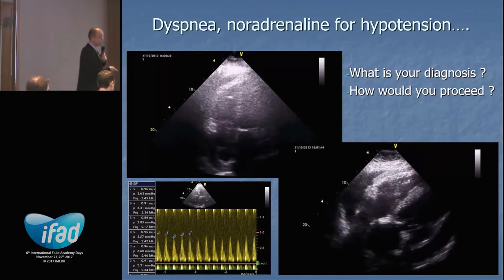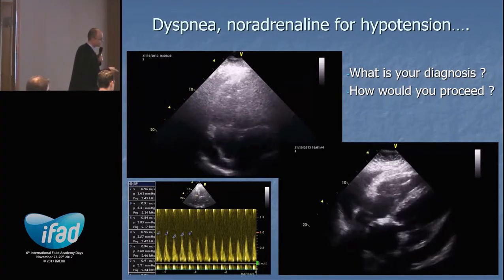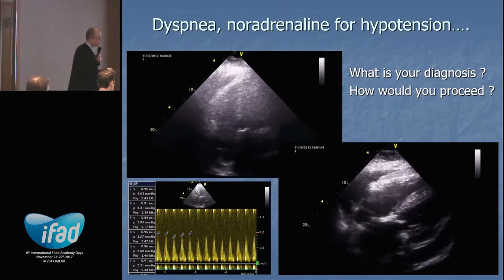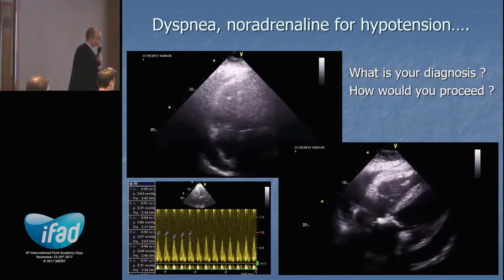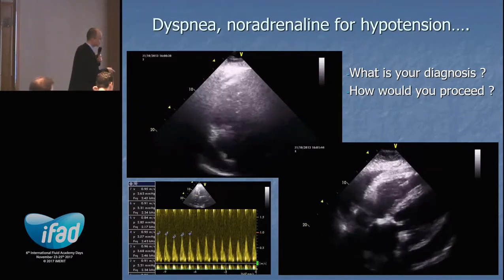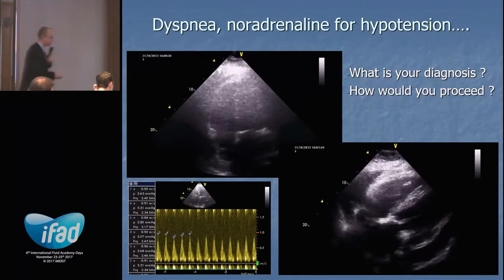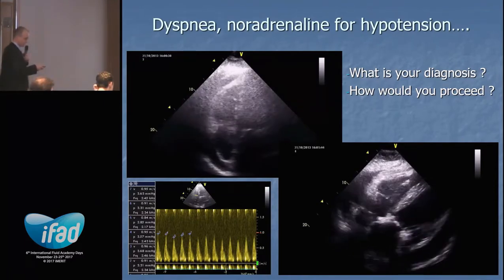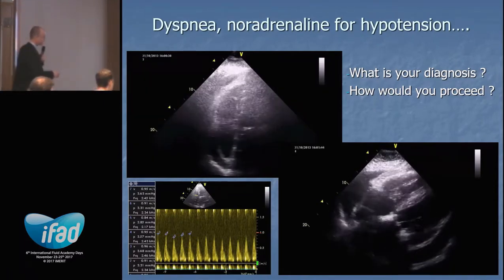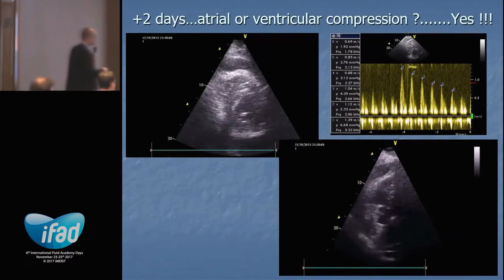He has a uremic effusion, and it's circumferential, but we don't see signs of tamponade. There's no collapse of the atrial structures, no buckling of the right ventricle. The transtricuspid variation is maybe 10-15%, not more. But there's a certain development, and two days later, you see this.